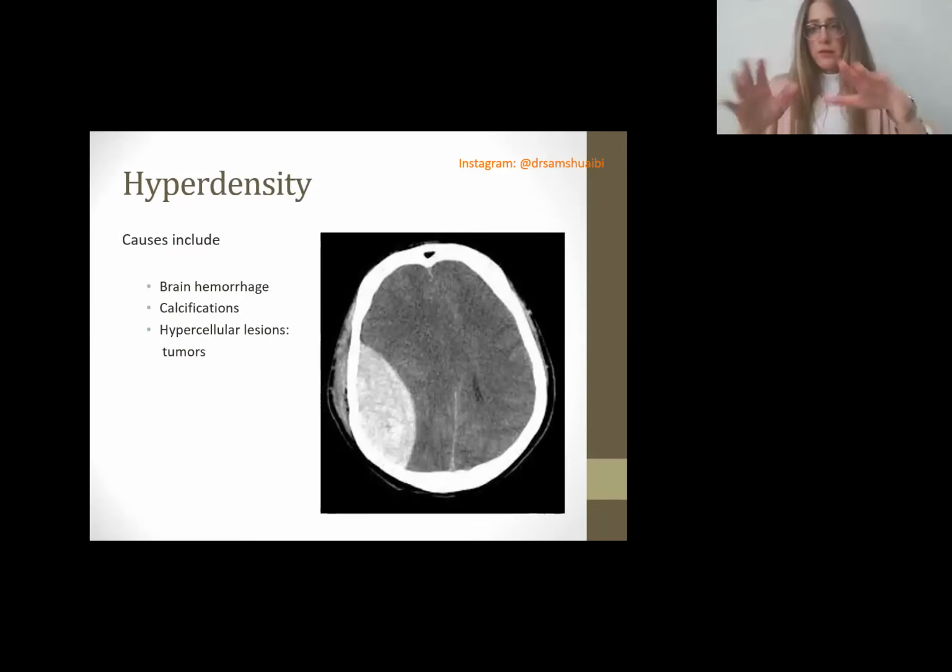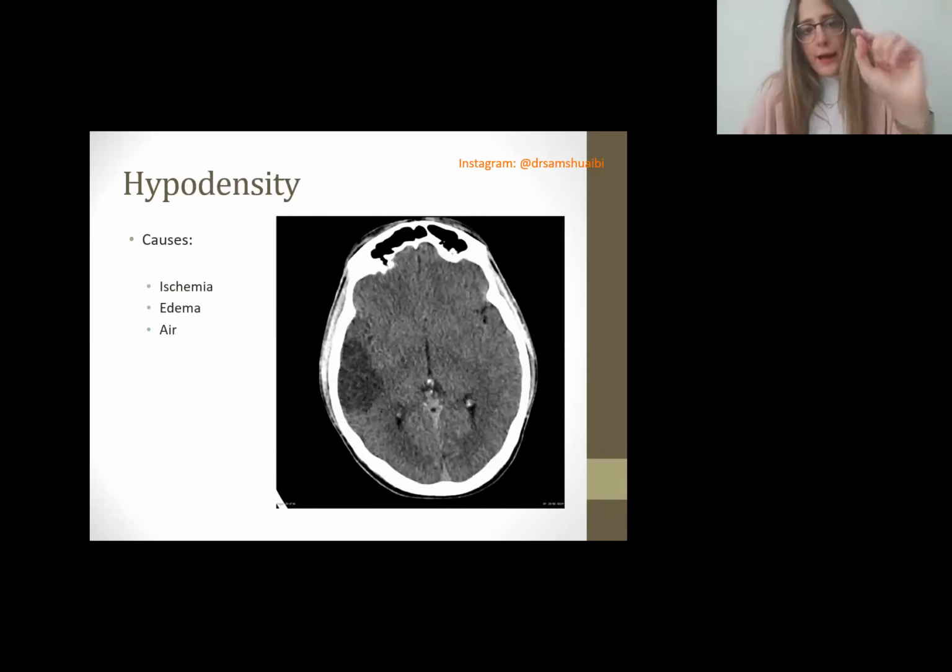Hemorrhage means, I know this is easy for a lot of you, but it's good to reiterate. Hemorrhage is a bleeding vessel. It's open and it's bleeding, okay? Whereas with ischemia, there is decreased blood flow. So basically this leads to ischemia and necrosis. So it's like dying out.